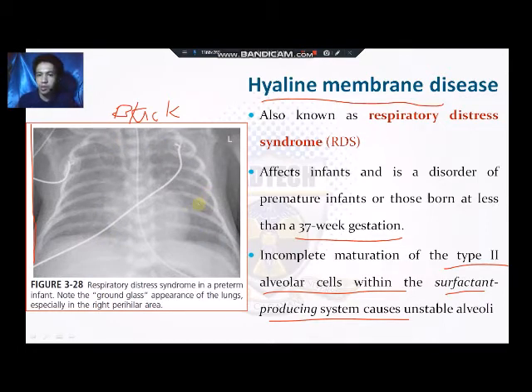But because of the condition ni patient, then sometimes na fluid accumulation within the alveolar sacs of the patient, the bronchial tree of the patient, and then the lung tissue of the patient, then munang mo appear sila as somewhat lesser ang ilahang radiolucency. Okay, so dili na kayo sila sobra ka black siya. So almost in the gray na nga portion. So pasabotan na that the lung fields are lacking air, no? Gamay lang ang air nga sulod niya diha sa iyahang lung fields.